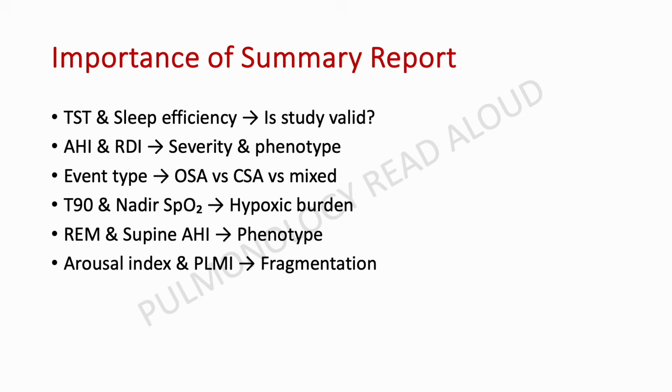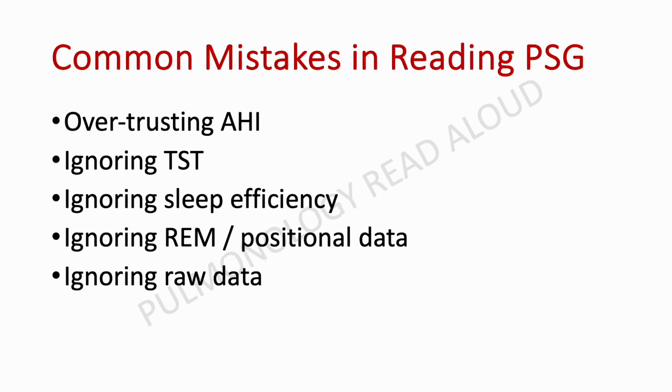So the importance of this summary is that you are actually telling how valid the study is. You're telling about the overall quality of sleep. You're telling about the severity and the phenotype of the patient. You're also mentioning hypoxia. You're also giving directions to treatment.